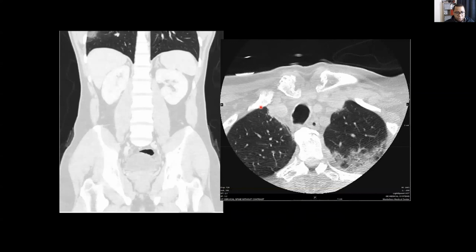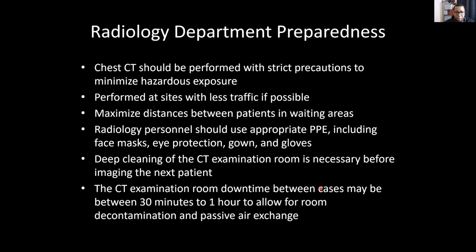This is just a study from our cases from our study showing CT abdomen, but catching some peripheral ground-glass opacities here. And here was a CT neck catching some peripheral posterior ground-glass opacities that triggered a COVID-19 test. That was early in the pandemic. Now everyone gets a COVID-19 test when they come into the hospital.